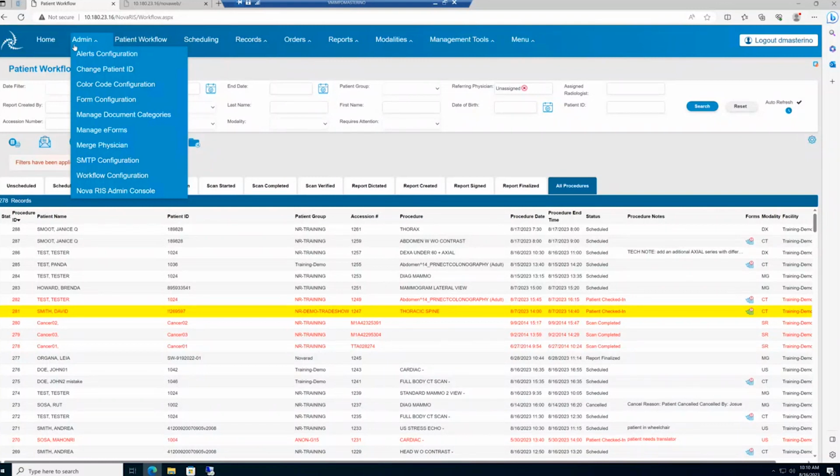But as you use the system over time, I found that I wasn't always looking this deeply into the system. A reminder that these features are available can help you use the system more fully. I always wanted to use the entirety of the RIS and PACS system to benefit my workflow. Sometimes just having these quick reminders about what's out there will trigger something and help you find a way to make things easier in your practice, which is what we all want.